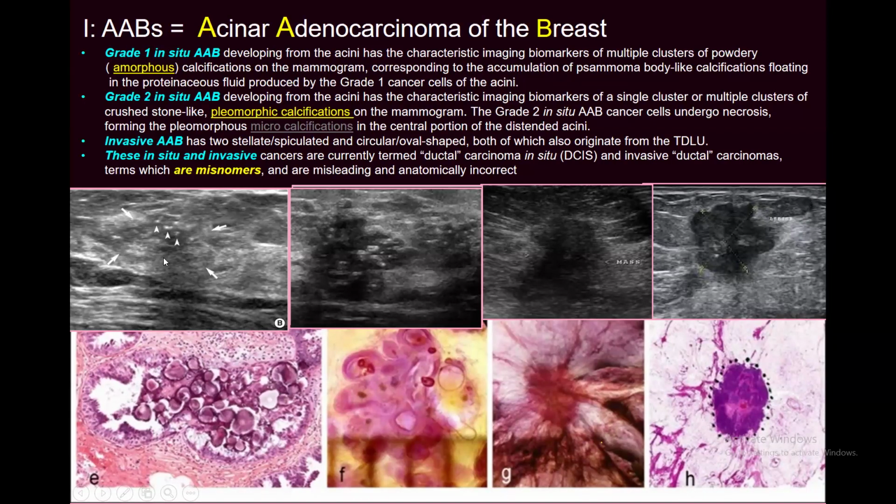Definitely, it will present well on mammography, and most of their correlation was with mammography, but I tried to bring some examples of ultrasound because our lecture is on ultrasound anatomy, or sonographic anatomy. That is why I did not bring the mammographic images. I correlated with ultrasound images.